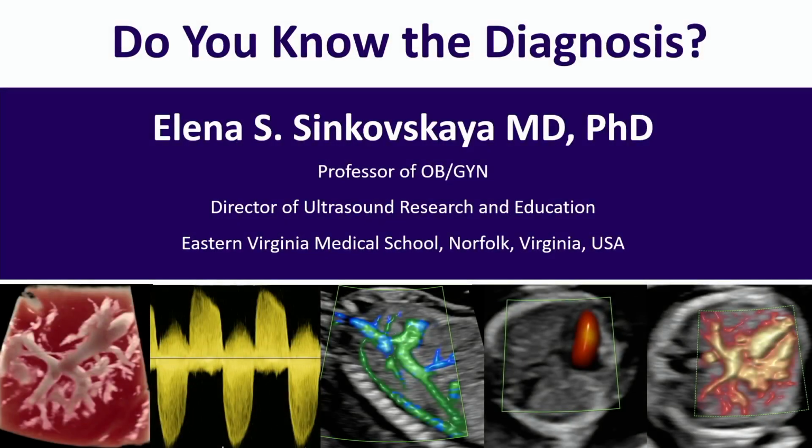So in this case presentation, I was wondering what should I put for the cases, and I decided that we will take a look at these two cases. This is something that you're not going to find in the textbook, and I just want to highlight how important it is to evaluate the screening views to arrive at the correct diagnosis. I'm going to show you specifically the standard screening views, and we will read them together to see how we can make those diagnoses that you're probably going to see once in a lifetime.